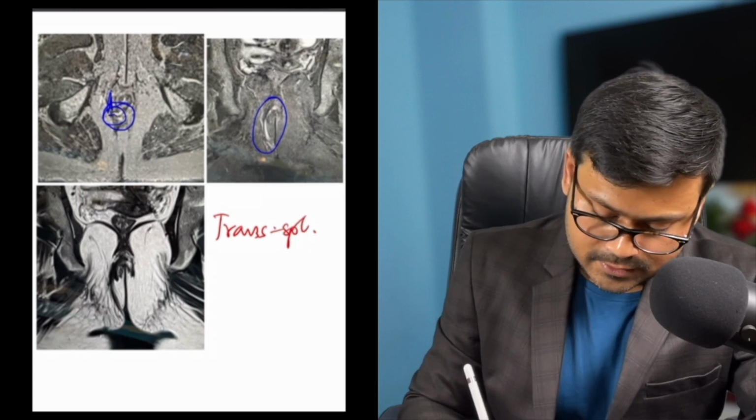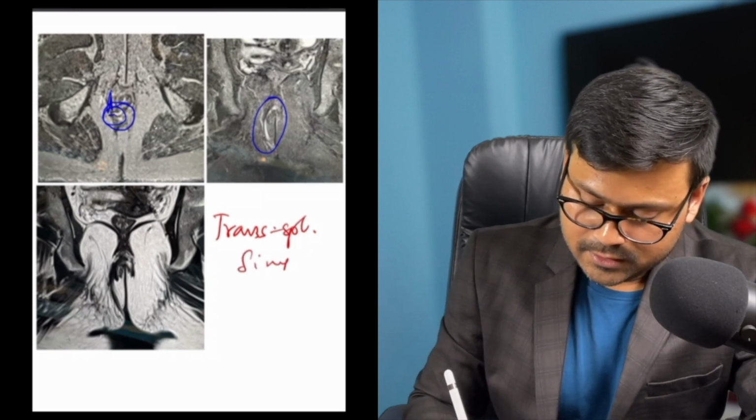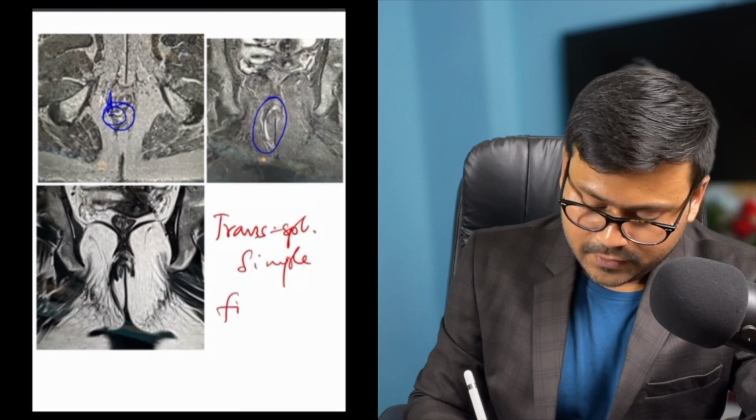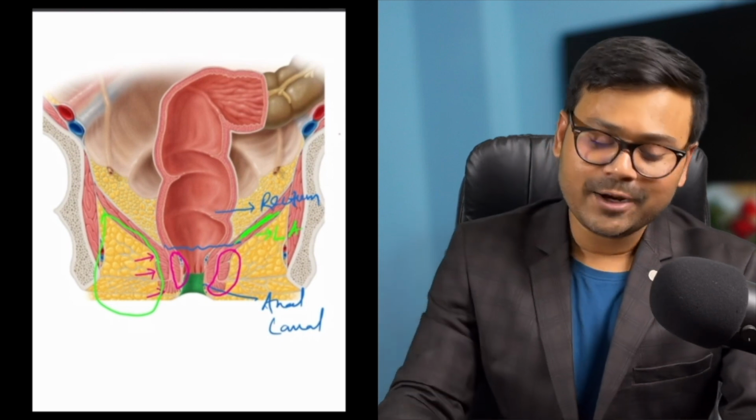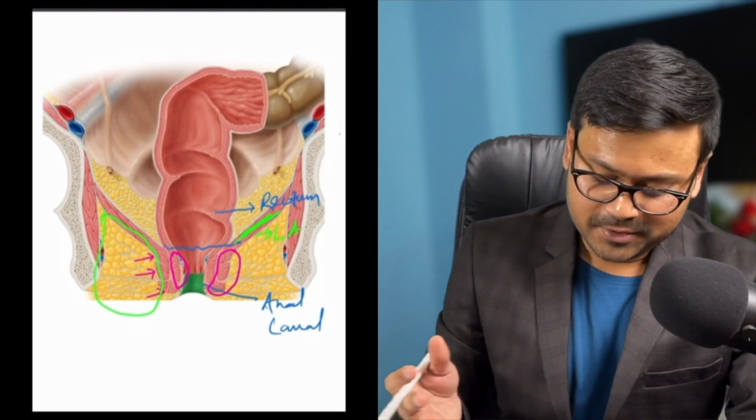Transsphincteric fistula, simple transsphincteric fistula and fibrous. This is fibrous. So I'm nearly done with my discussion. Let's have a quick brush up.